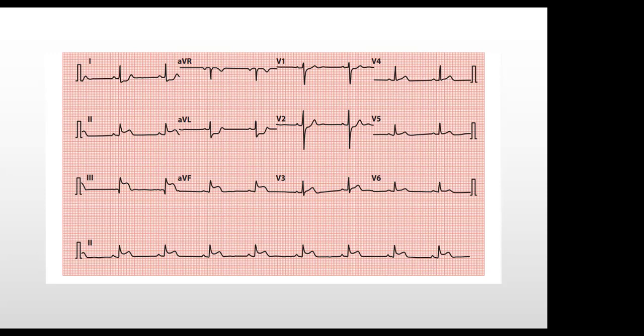Yeah, so it's more of a distal part, which again, remember that the distal part tends to supply the posterior aspect of the heart. And here we're seeing a mirror image of ST segment depression in the anterolateral leads.